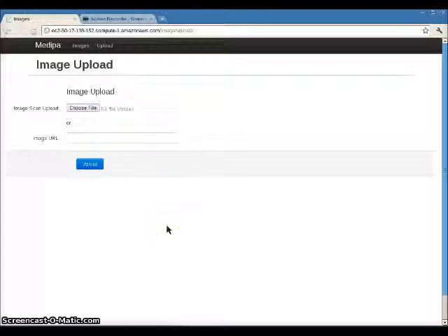And once you hit the upload button, a background process kicks off, which converts the image to a PNG image file and allows for lossless compression, which reduces the size of the image and gives a better user experience because the user doesn't have to wait as long. It also reduces the images to different levels, so it's an 8 times reduction, a 64 times reduction, and a 512 times reduction. And so this allows the image to be almost instantly displayed to the user, and then we can increase the resolution the longer the user is at the site.